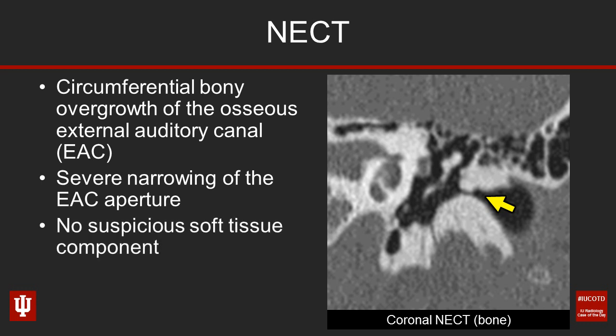But importantly, we don't see any soft tissue mass component, and the bones look clean. There's nothing that looks destructive or chewed up or ratty or aggressive about these bones to make us think we're dealing with an aggressive process. So, what does this patient have?